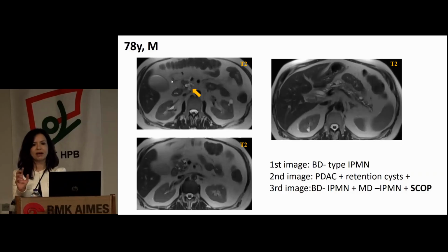These were all detected by on-site pathology radiology correlation from one of our studies. It was a thesis study. This patient has a side branch IPMN in the uncinate process. There was a PDAC, not very well seen here, I know, but there are some cysts around the PDAC.